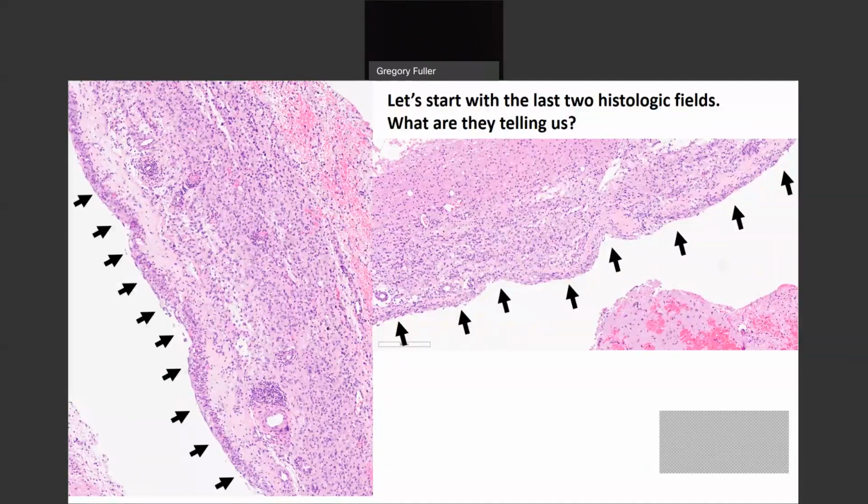You see other natural boundaries. This looks like a natural surface. It's smooth, and we're trying to figure out what it is. And what you see beneath it is just parenchyma. In this case, it's vascular proliferation, and there may be some tumor, etc. But it's a very smooth lining, and that is formed by compression from the cyst contents. That's where that comes from.